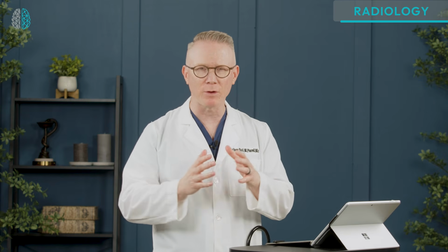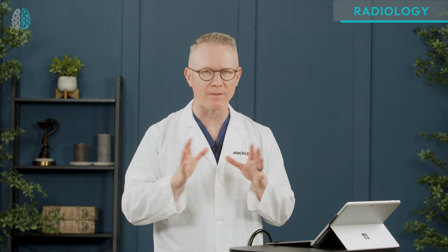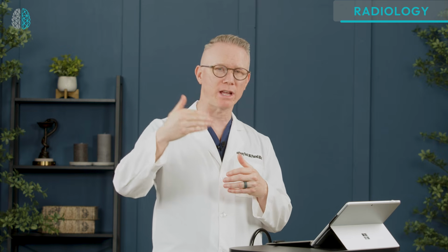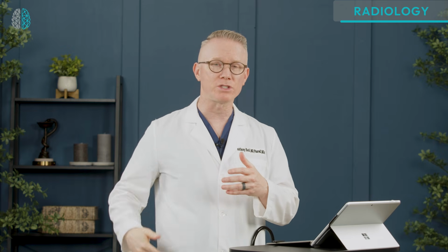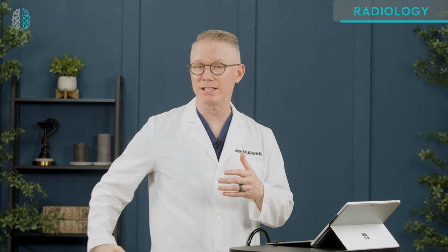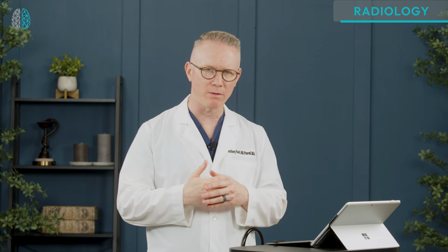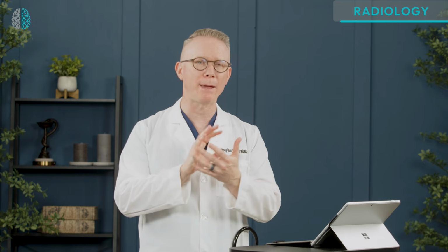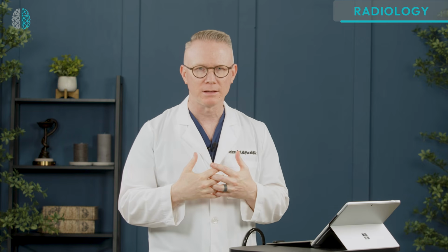Well, AP films have the ability to magnify the cardiac silhouette because the heart sits closer to the x-ray tube versus the detector plate that is behind them in an AP view, which is why, again, people would switch and go to a posterior-anterior view to get the heart closer to the plate.